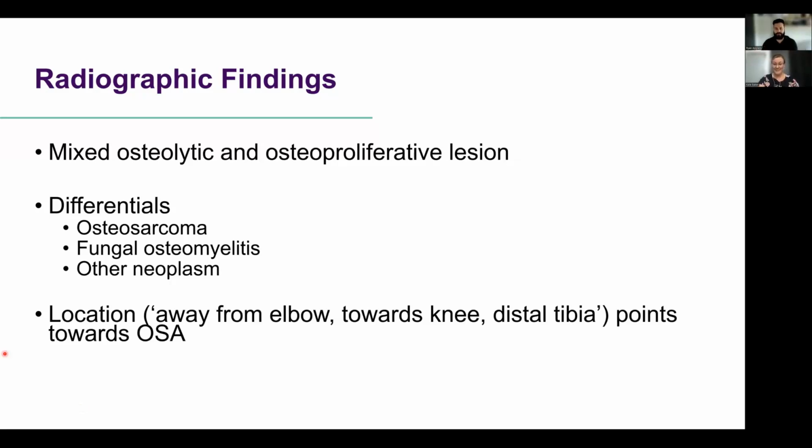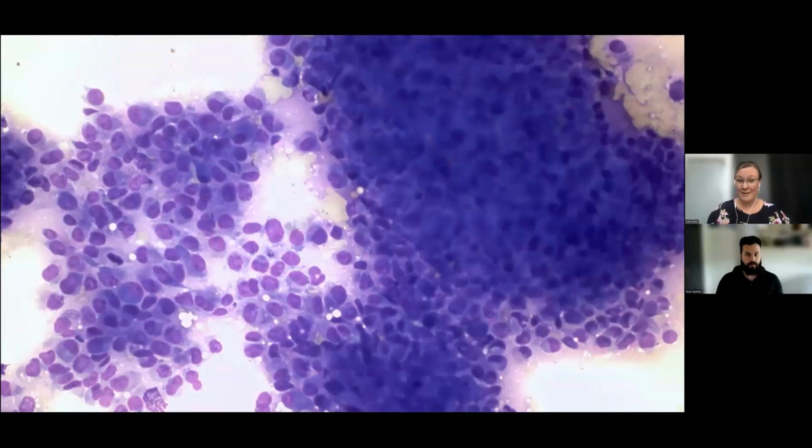All right, so let's take a look at the cytology sample now. So here we are looking at this cytology sample from this bone aspirate. The first thing to think about here is that this is really cellular, which I always say we really like as cytologists because we want cells to look at, but bone should not exfoliate normally very well. If you stick a needle into normal bone, it's really not going to give you many cells. What you might see there are normal bone elements like normal low numbers of osteoblasts, maybe an osteoclast, but really it shouldn't be highly cellular.